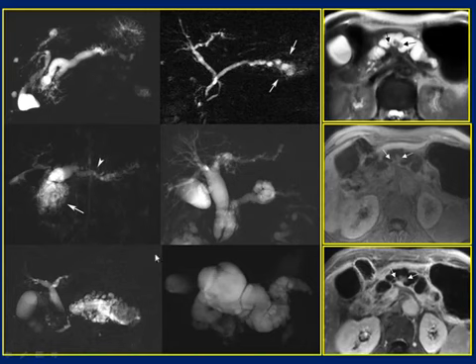You can see that in some cases, the enlargement and the involvement of the main pancreatic duct is very, very large, very impressive. In other cases, we will see filling defects within the dilated pancreatic duct. These filling defects may be due either to mucus content or to papillary projection, as in this case, where we see this papillary projection inside the dilated main pancreatic duct, showing enhancement following contrast administration.